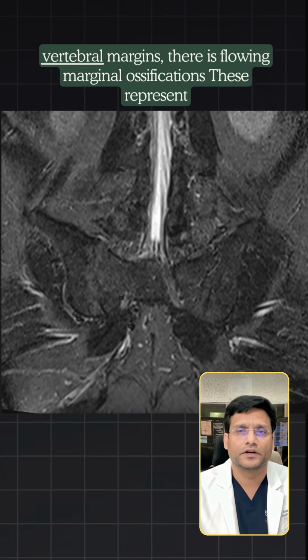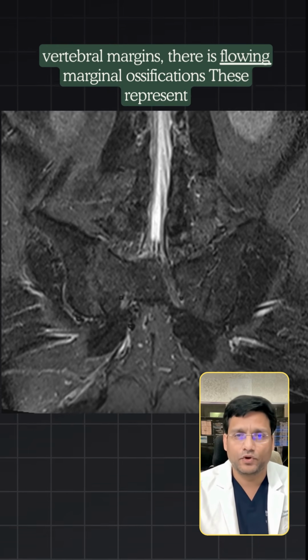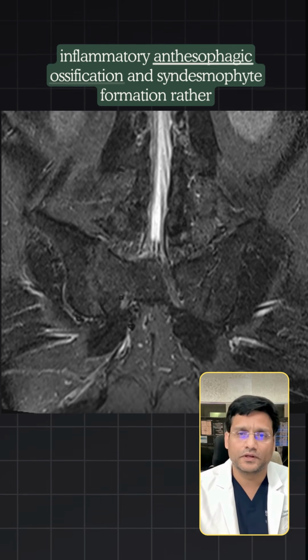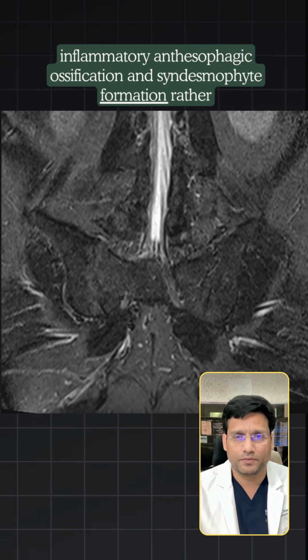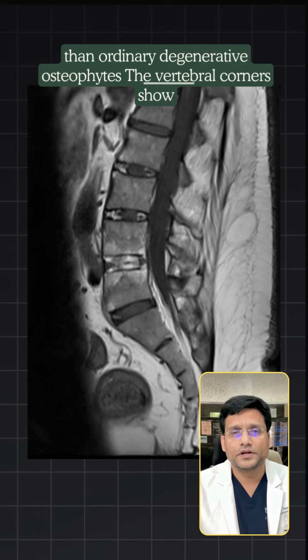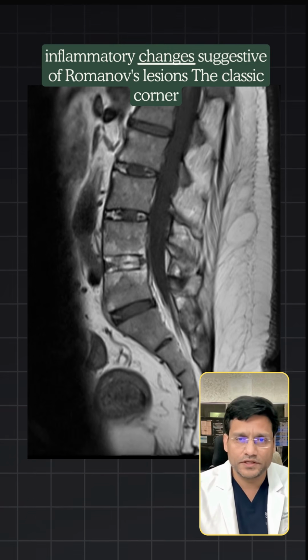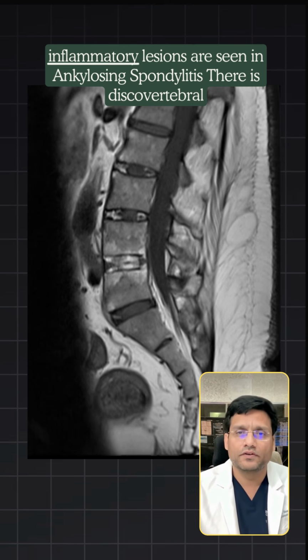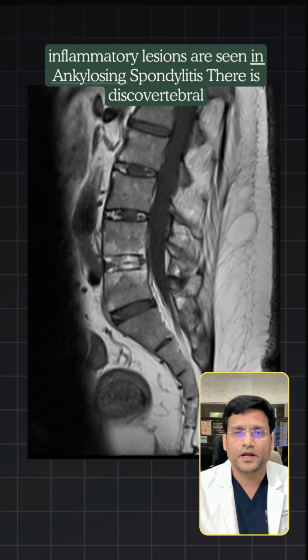Along with anterior vertebral margins, there is flowing marginal ossifications. These represent inflammatory enthesopathic ossification and syndesmophyte formation rather than ordinary degenerative osteophytes. The vertebral corners show inflammatory changes suggestive of Romanus lesions. These classic corner inflammatory lesions are seen in ankylosing spondylitis.